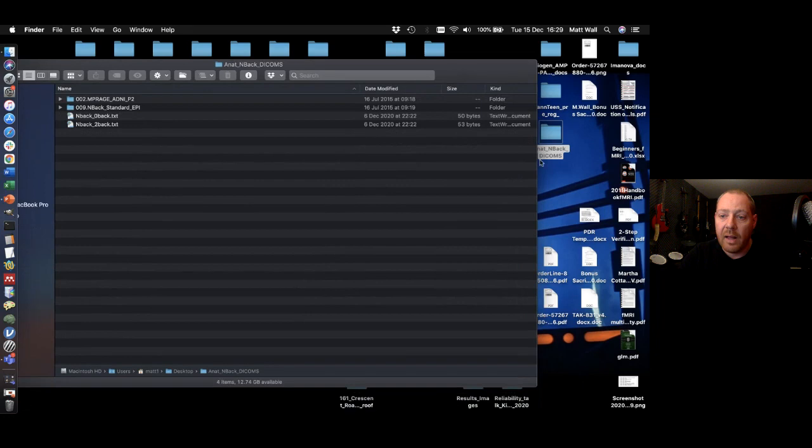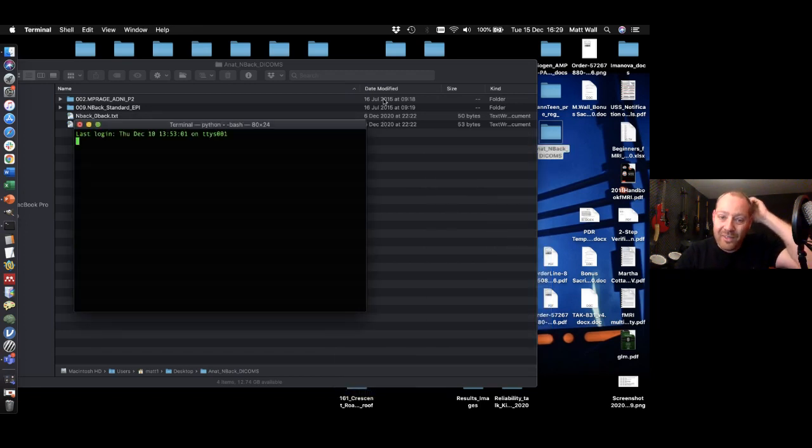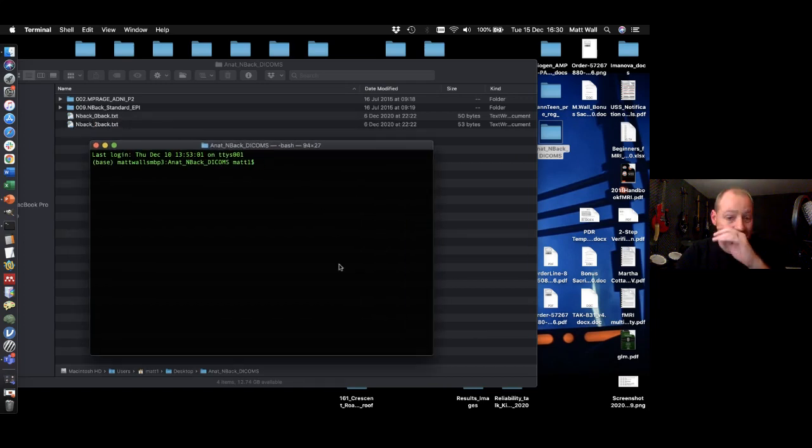So I'm going to zip through this quite quickly because I am running out of time, I'm afraid. For those of you who may not be starting out with this stuff and maybe a little bit unfamiliar, not familiar with command line stuff and Unix, this is going to look a bit like I'm hacking the matrix or something, but it's not that difficult. It's quite easy to get your head around, actually.